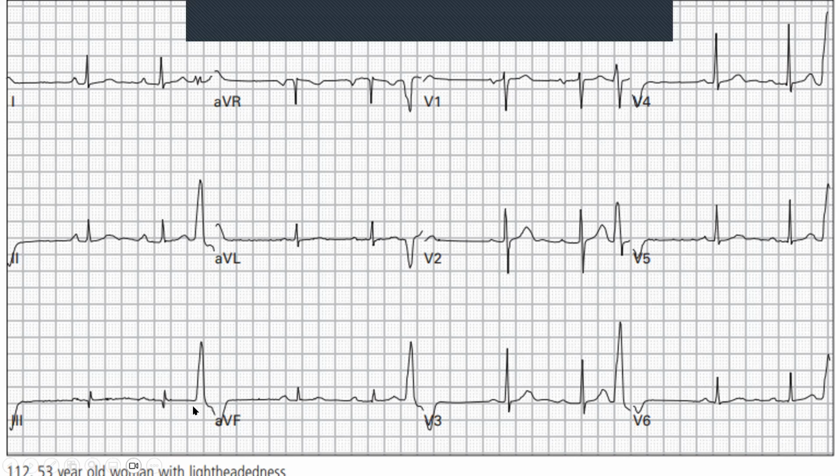So what's happening with these beats? You've got a normal QRS complex, and then do you have a P wave before this? If you look everywhere, it's a T wave and then a wide QRS complex. So a wide QRS complex is something coming from the ventricle. So it's an ectopic beat, but the question is, is it ectopic from the atrium or is it ectopic from the ventricle? Is there a P wave? No. So is the atrium involved? No. So it's an ectopic ventricular beat. Do you guys see? Or premature ventricular contraction.